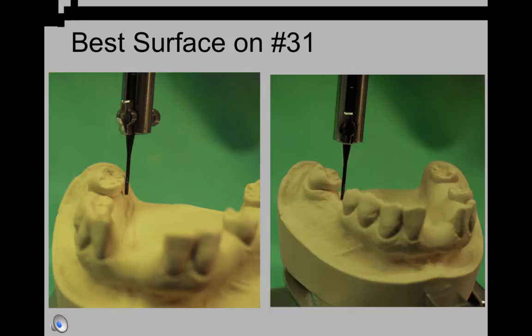A ring clasp is the best solution for this type of area because it starts at the mesial, the reciprocal component is on the buccal surface, another rest is placed on the distal, and the direct retainer arm originates from the distal and comes forward into the 0.01 undercut on the mesiolingual. This would be the best solution for this type of undercut when you have it at the mesial aspect of the tooth. You often find this on tilted molars that lean to the mesial and to the lingual.